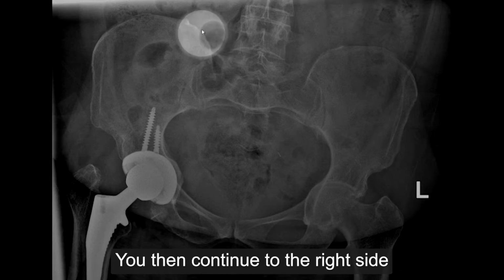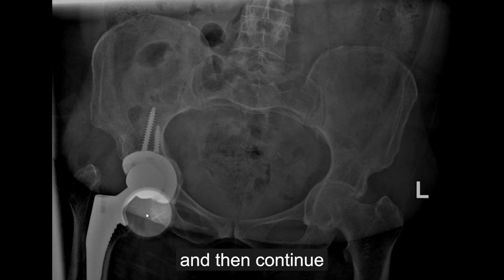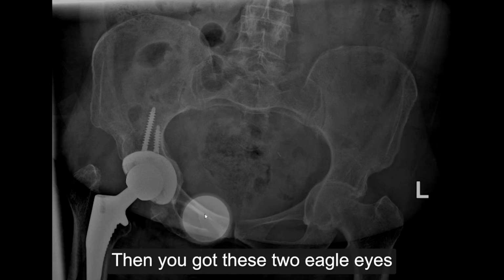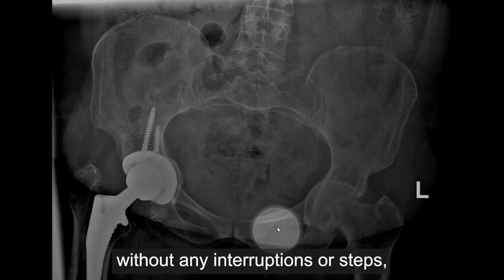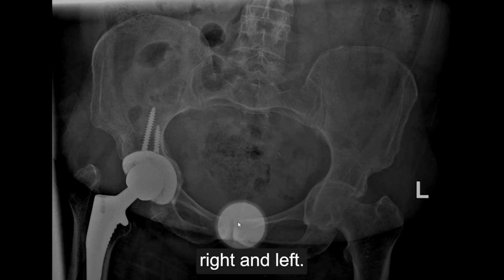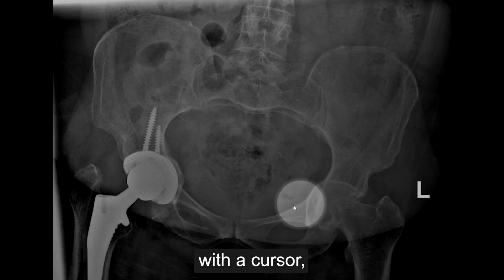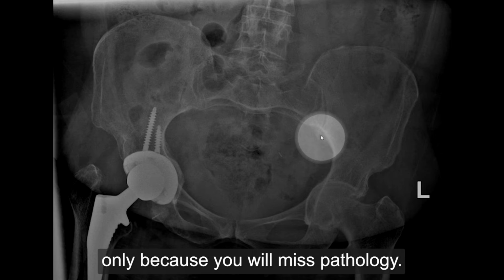You then continue to the right side and make sure that you follow the borders of the bone until you go all the way down, and then continue to the inferior aspect of the pubic bone till you reach the pubic body. Then you've got these two eagle eyes that you have to make sure are complete without any interruptions or steps, right and left. And now you follow again from the superior aspect of the left pubic ramus, going all the way to the left side, and make sure you follow it with a cursor, with a pen, with a hand, but don't follow it with your eyes only because you will miss pathology.